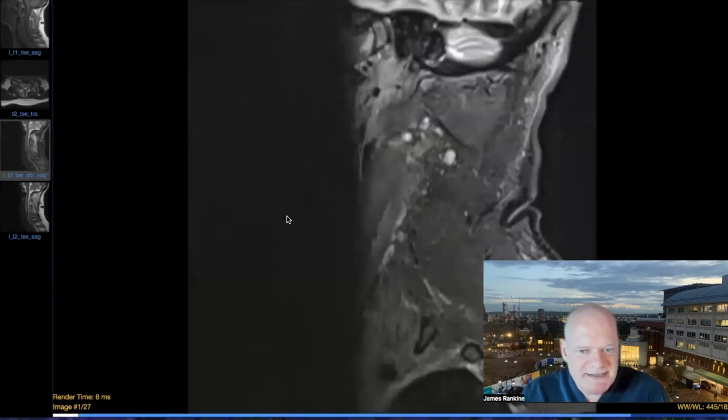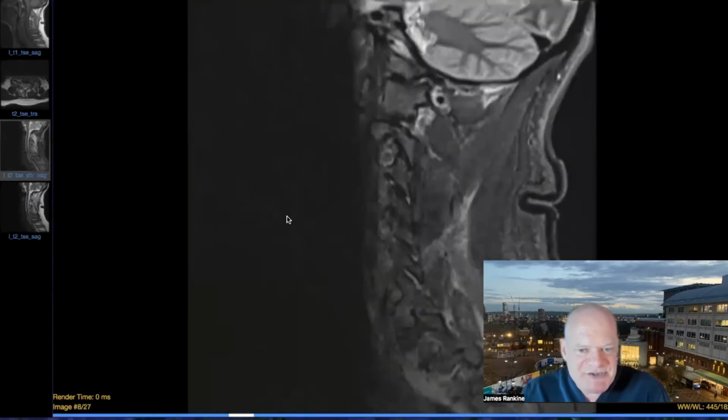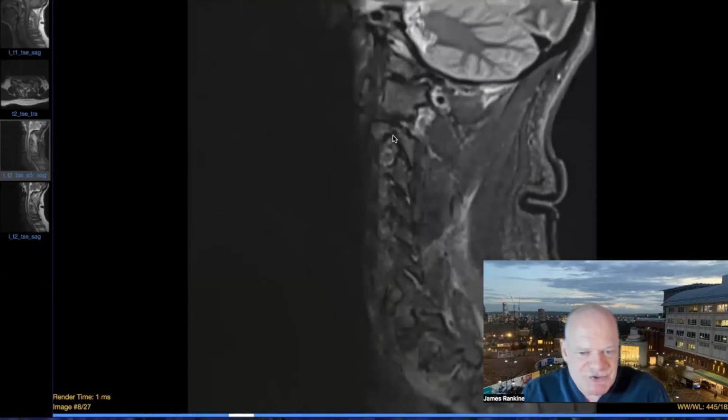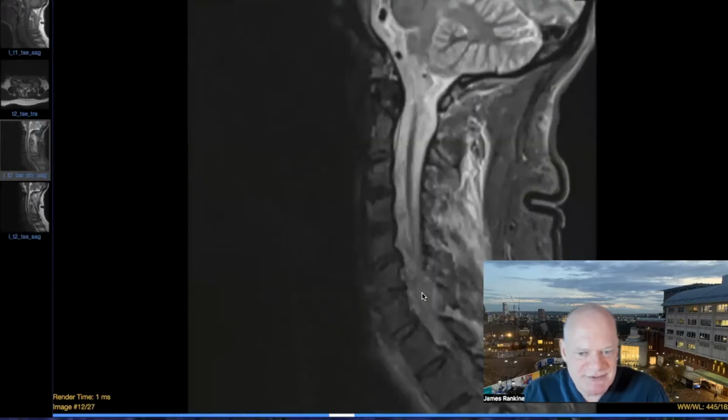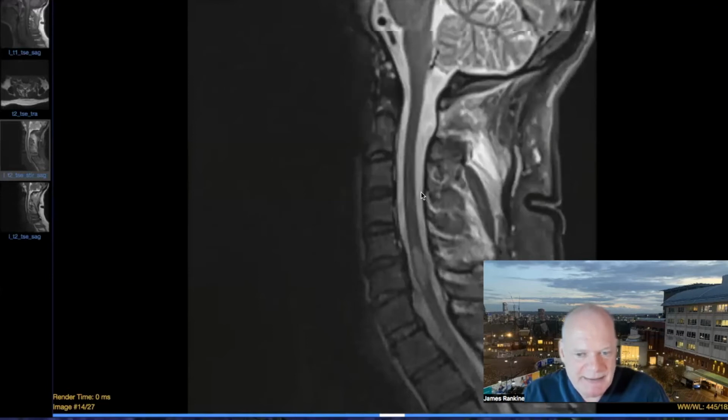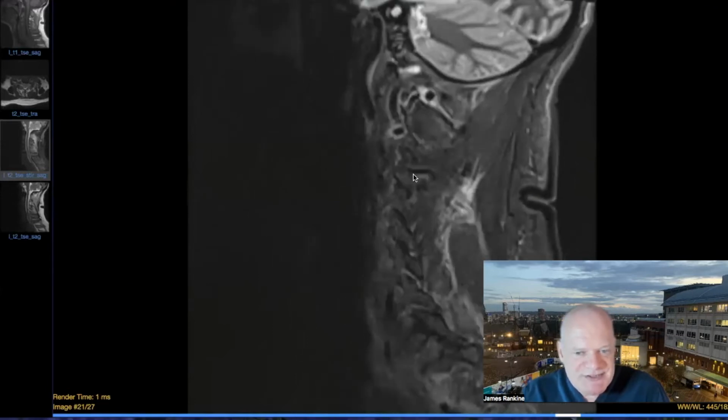So when we go to look at the MR of this case, what we expect to see, going firstly to the parasagittal STIR sequence just adjacent to the facet joints, I don't expect to see a great deal of edema related to the facet joints. I may get some edema related to compressive fractures at the back, but I won't see any marked edema there that I would expect with a flexion injury.